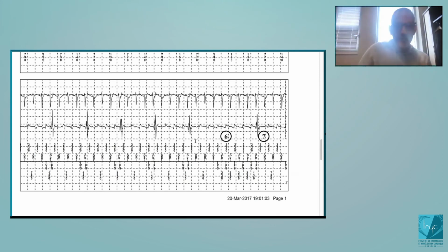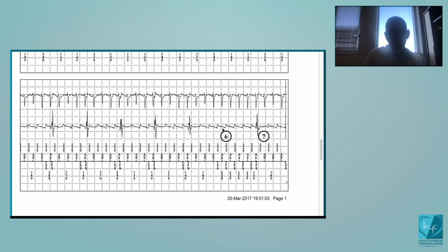And then the good point here is that since it's adaptive, anytime you sense here, and since the patient is non-dependent, there is a ventricular spontaneous activity. And if there is a ventricular spontaneous activity, the sensitivity will readapt to the level of these signals. Here you see that there is no spontaneous ventricular activity. And that's why when you are pacing dependent, if you are in complete AV block, you considerably increase the risk of prolonged oversensing. Because if there is a spontaneous ventricular activity, then you will readapt to this.